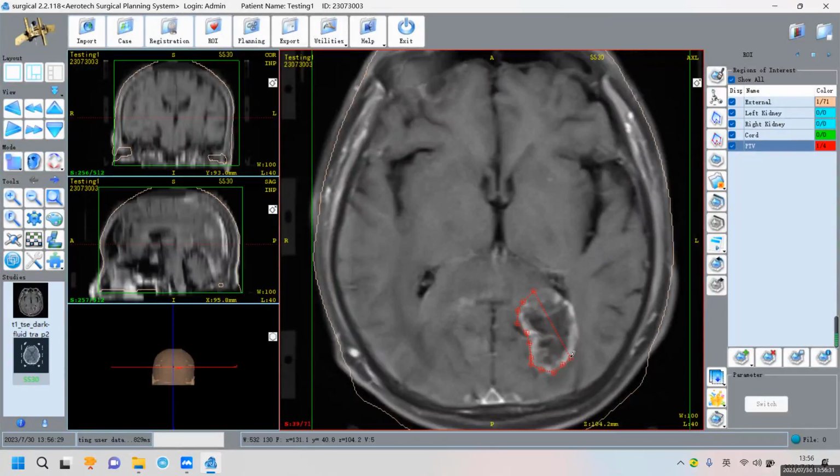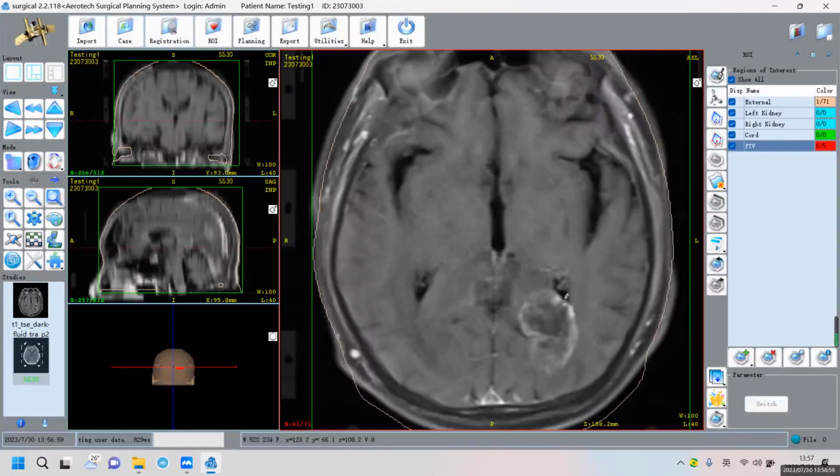For the point tool, we click one point, click, one point, click, one point. Now, after it is finished, we can give a right click to finish the tool. Normally, the point tool is the first choice for you to do the marking, because it is more precise.